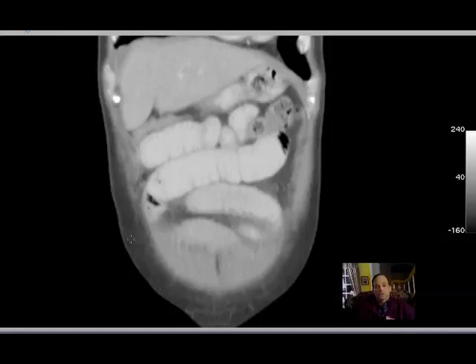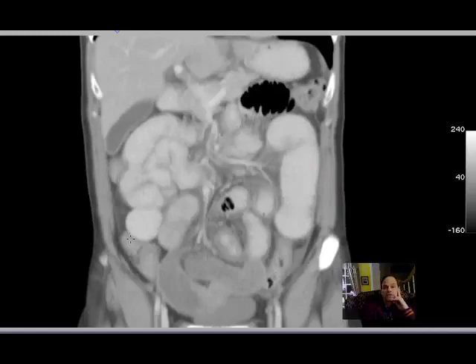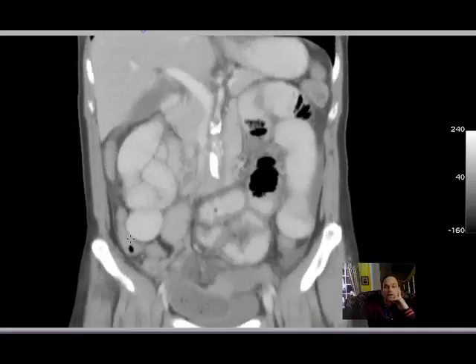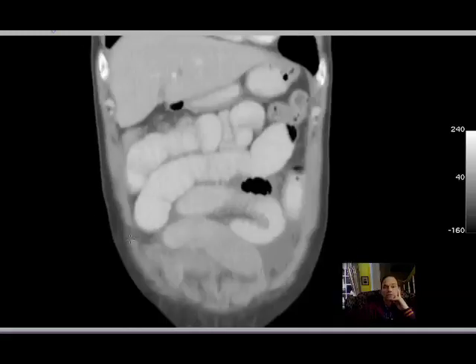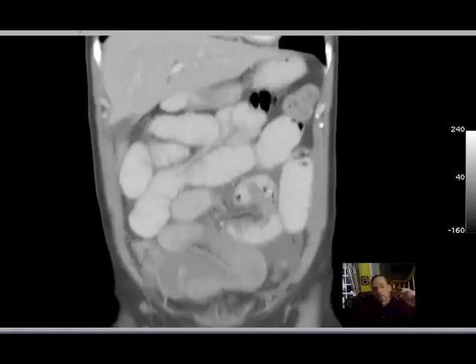The patient's in a great deal of pain, and an NG tube can be placed to decompress some of the bowel, the stomach, and some of the proximal small bowel, and make the patient more comfortable, and get that information to a surgeon in a timely manner. Maybe 10 or 15 minutes can make a difference between whether the surgeon has left for home or not.